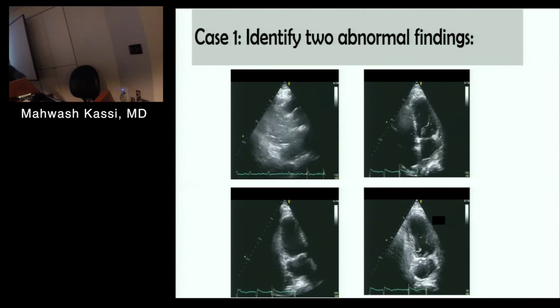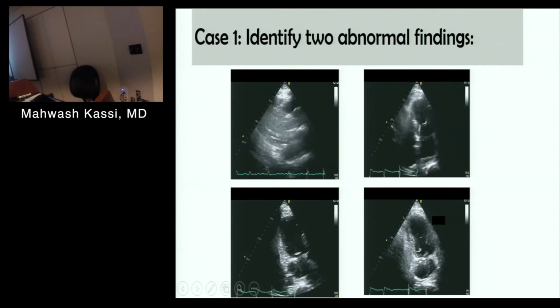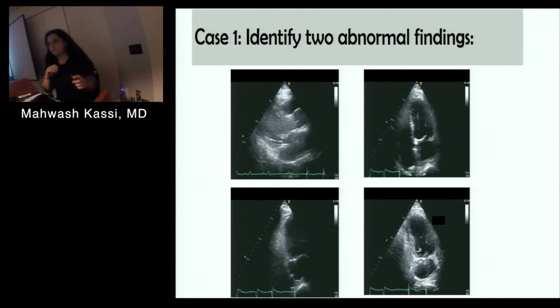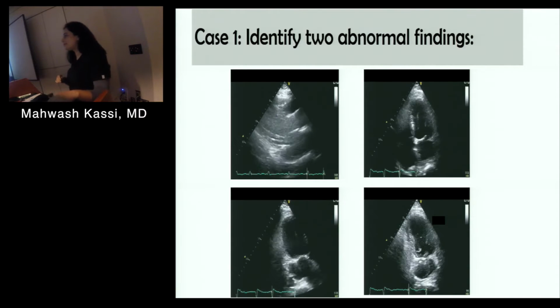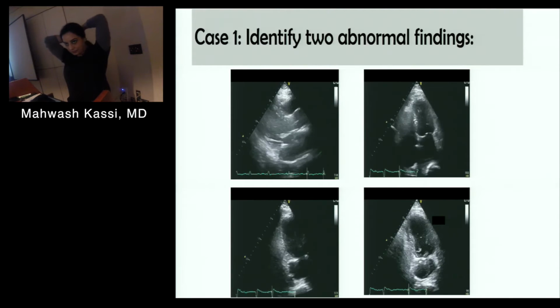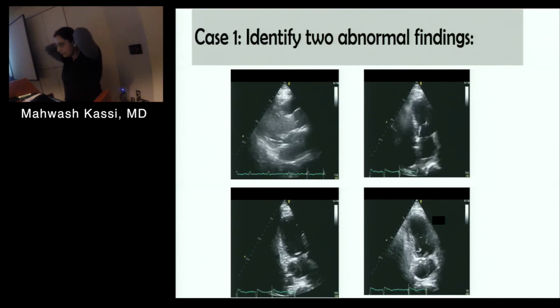So I'll just point at it. Really, I'm hooked, so I have to move with this. But I guess, what is this structure? Myxoma? So what do you think it could be? Any other? A cor triatriatum would typically be in the other direction, the same thing as the valve.